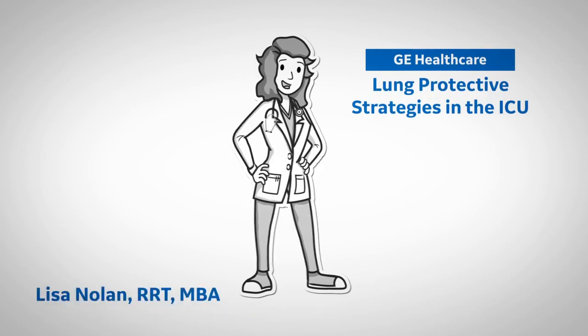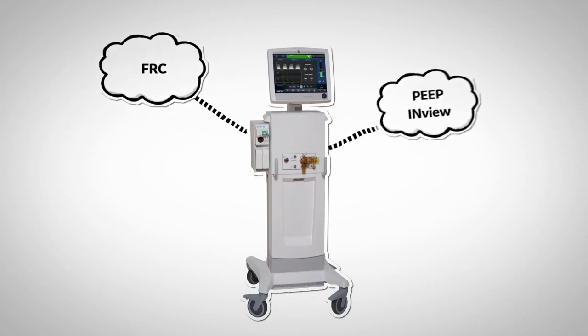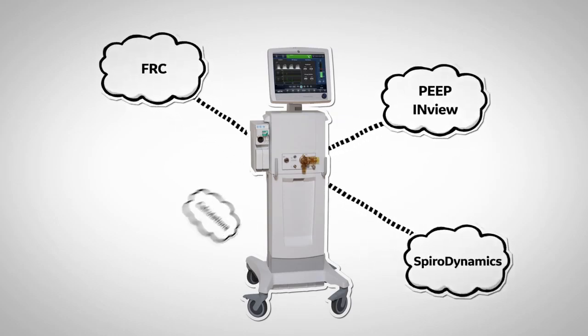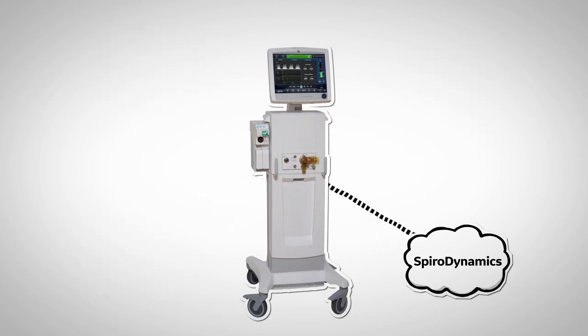I'm Lisa Nolan. The CARESCAPE R860 offers a wide array of advanced ventilation tools to help with the clinical decision-making process around lung protective strategies. Throughout this series, we will discuss these tools in more detail. Today, we will discuss spirodynamics.